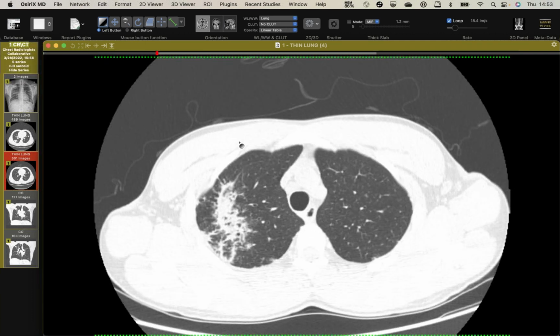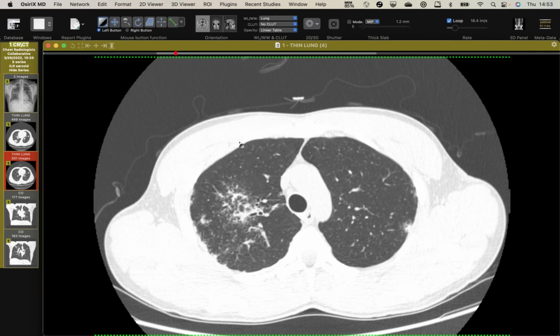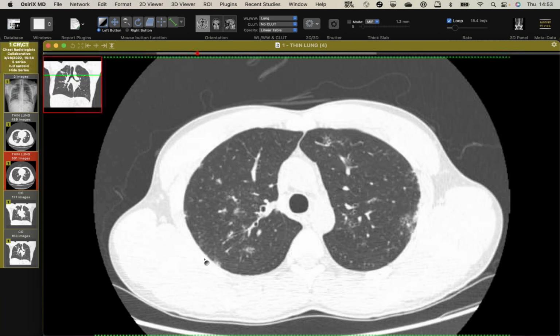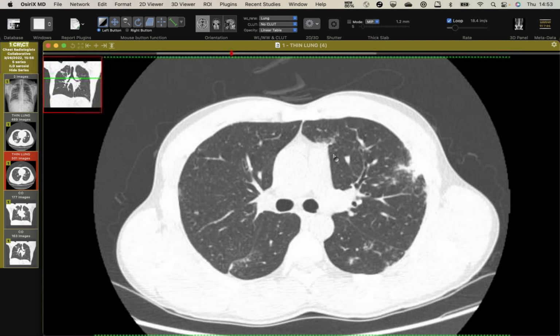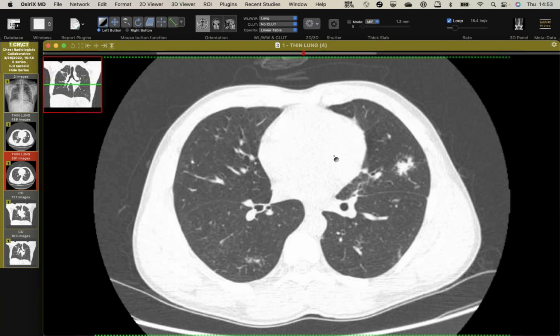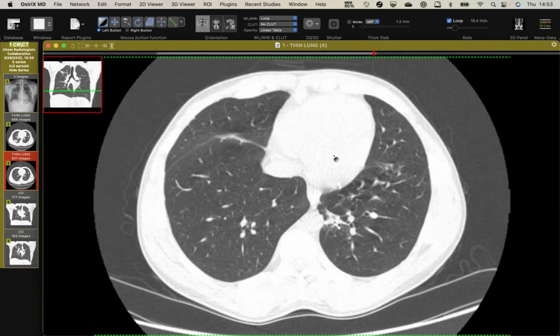And it's kind of cool because now if you saw this scan, I think most of us would be very confident in calling this sarcoid. You've got galaxy signs. You've got perilymphatic nodules all along the pleura, the bronchovascular bundles. There's a little bit of interesting cavitation in some of the areas. So this is what they used to call years ago the alveolar sarcoid. I never liked that term.